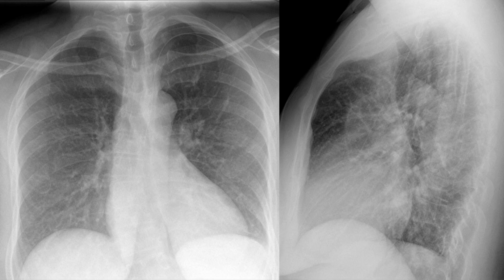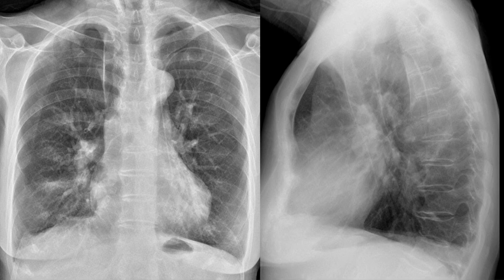So coming back to this one, this catheter is arching well above the scalene tubercle. It's coming down. Lateral view, looks like it's coming down into the ascending aorta, interestingly enough. We would predict this to be an arterial catheter placement, which it was when they put a pulse transducer on it. This one, on the other hand, is arching well below the scalene tubercle, and on a lateral view, it's coming down in this fashion. We would suspect this to be a venous catheter, and on pulse waveforms, it was indeed.